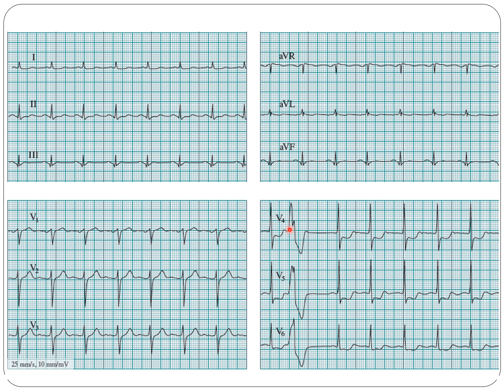The next one we should look at is the ST segment. The ST segment can be elevated or depressed. Here we don't see any changes of the ST segment. Here, however, in V4, V5, V6, we do have a horizontal ST depression. That can be the sign of subendocardial lesion.